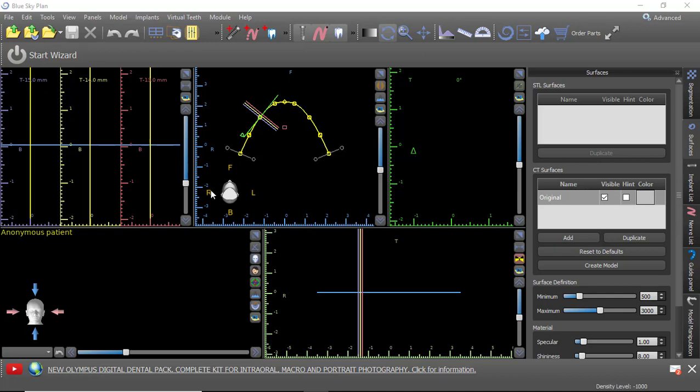Okay, this is Dr. Corey Glenn, and I'm going to be doing some demonstrations of how to use the Blue Sky Bio software, and so we'll just go through several cases. In this case, I'm going to start with case one.